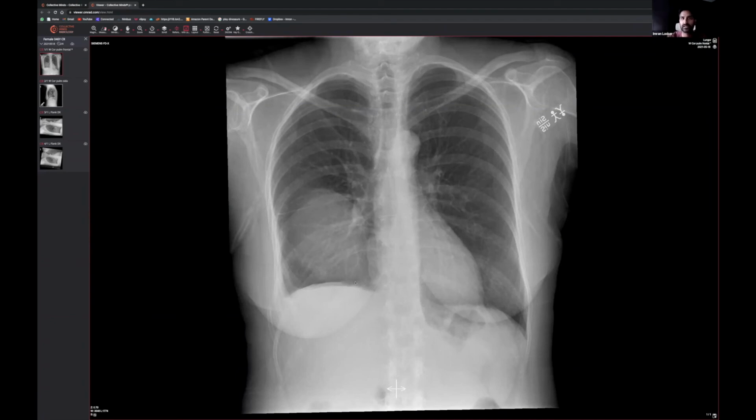When you're saying collapse of the lung, you've got to think, okay, is it tenting of the diaphragm, hemidiaphragm? Does that look tented? Not really. That looks very, very flat. But yeah, you do have a bit of blunting of that costophrenic angle. Look at that costophrenic angle compared to that one. So that is some fluid within that right hemithorax.